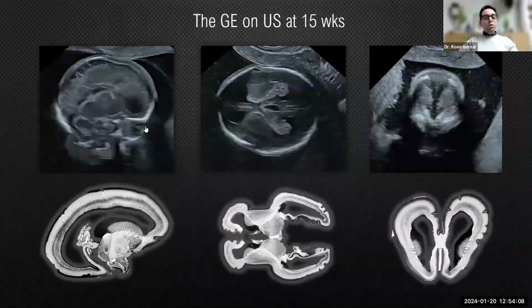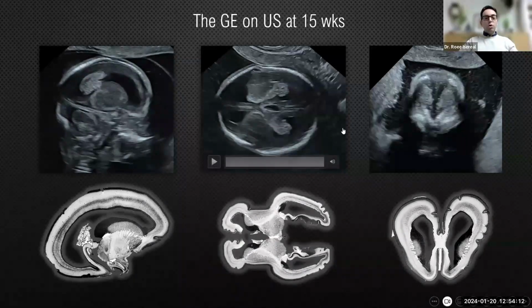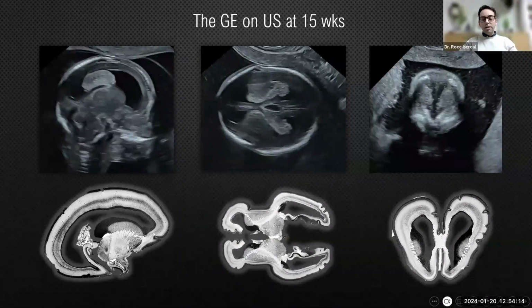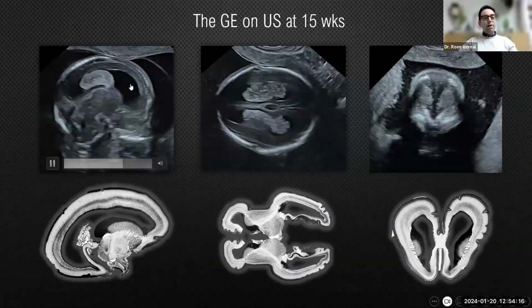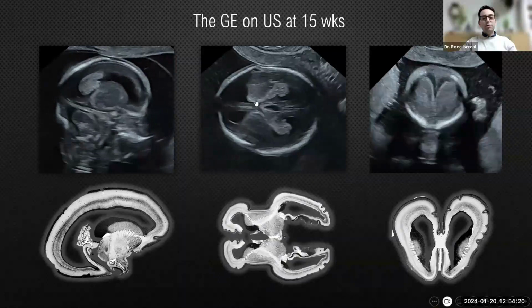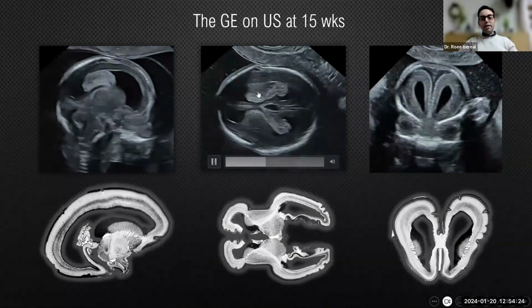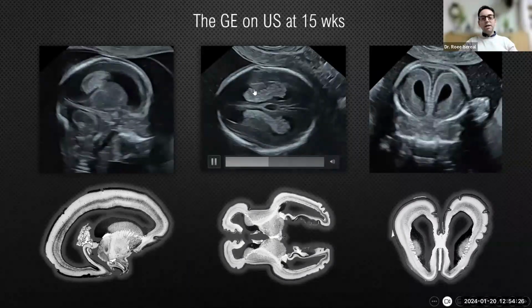How does this area look on ultrasound during early pregnancy? You can see all three orthogonal planes with the corresponding histological images. This is a parasagittal image. You can see the bulgings into the lateral ventricles in normal fetuses. You can see here on the axial plane view these echogenic bulgings into the lateral ventricles.